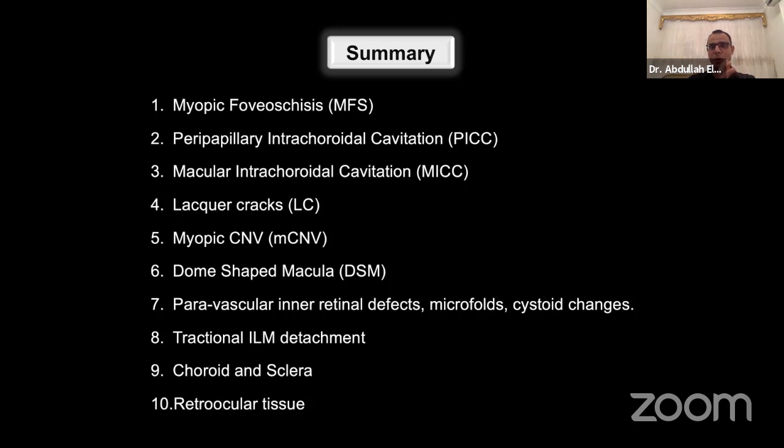In this cohort of patients, I usually repeat the scan 2 or 3 weeks later, or even 4 weeks later. The theory is that if it's a CNV, it will leak more, or you see more exudative changes. If it's just a simple hemorrhage, it will clear up to some extent. But with the advent of OCTA, I think we'll be able to at least make a differentiation based on OCTA.